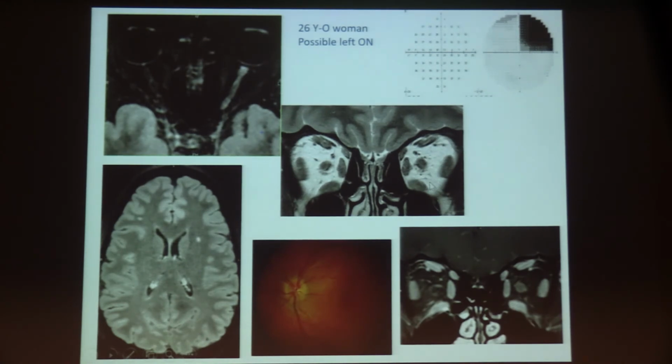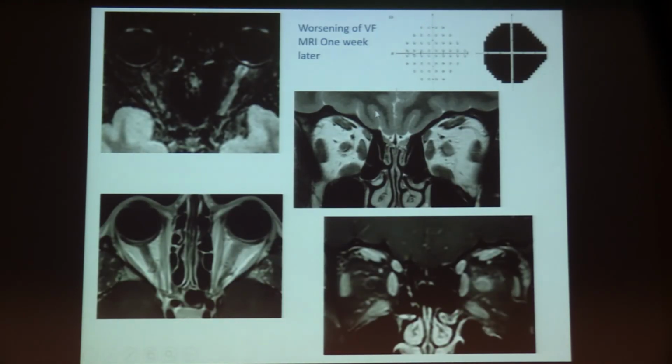And on the T2 images, perhaps there is something, really, the signal is the same. We have 2 spots on FLAIR. There is a small edema, and the only sign that is strange is that there is an enhancement of the optic nerve. One week after, as she's worsening, and the papillary edema is very important, you can see it very well on the FLAIR image. And look at the FLAIR. The edema is always very well seen on this FLAIR. We perform the MR again, and this time the optic nerve is enlarged.